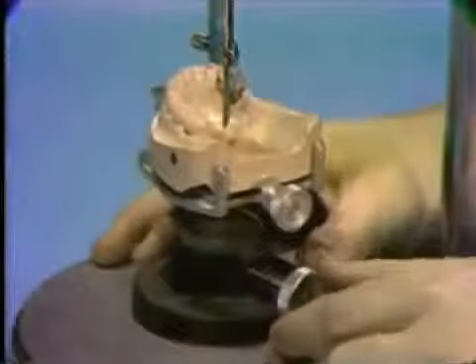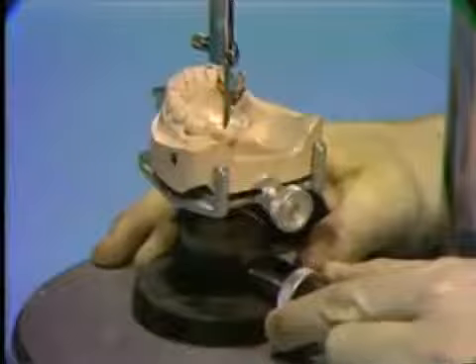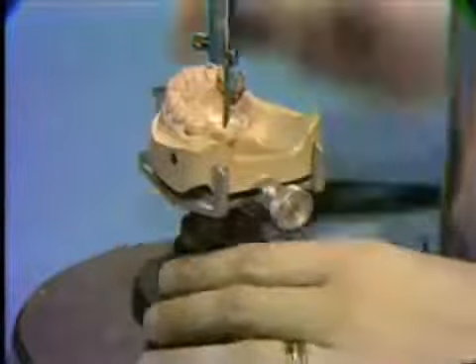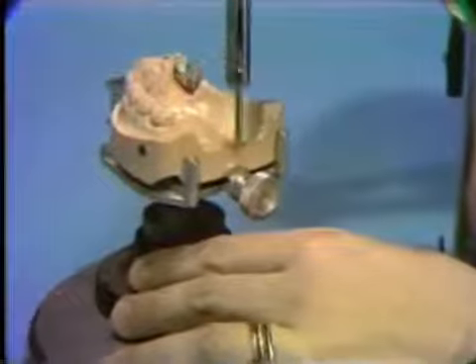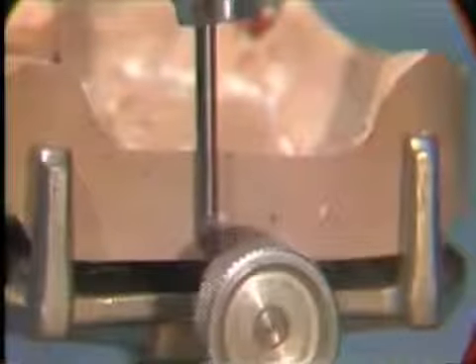Then, all tooth and tissue undercuts around the arch must be examined and either eliminated or minimized as much as possible by tilting without losing either the guide plane or the retentive area. Once this final path of insertion is selected, the cast holder must be locked to hold the cast in that position. Inasmuch as the cast will have to be removed and relocated on the cast holder during the wax-up procedure, it becomes necessary to preserve this path.